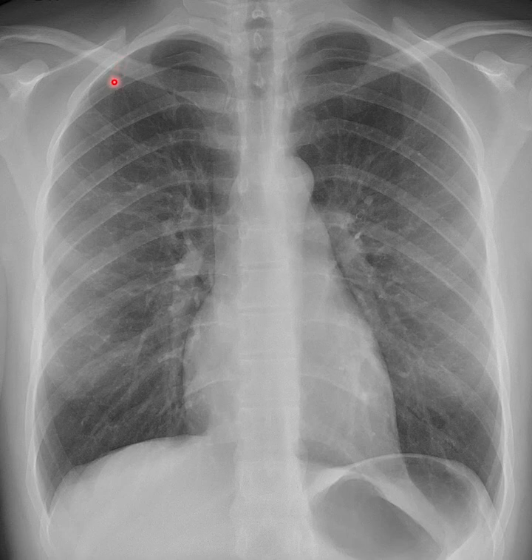If you can see this little shadow here, this is the scapula that we're seeing. So we're seeing the vertebral border of the scapula here, and all of this little grayish area in here is scapula superimposing the lung fields. And that we do not want to see in our x-ray.